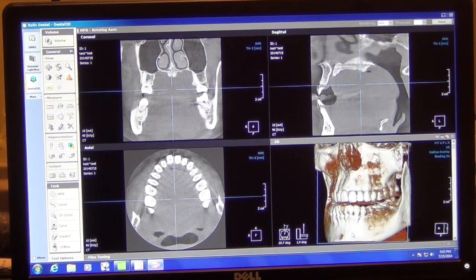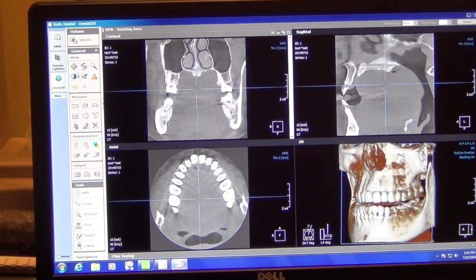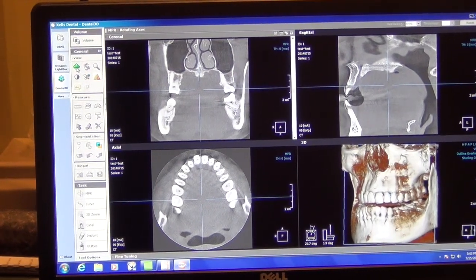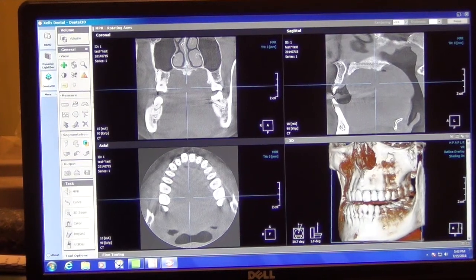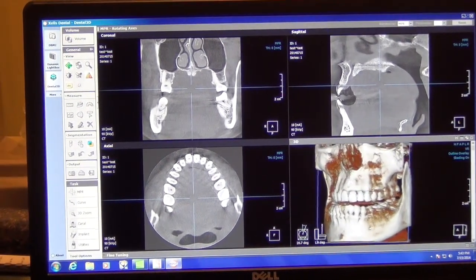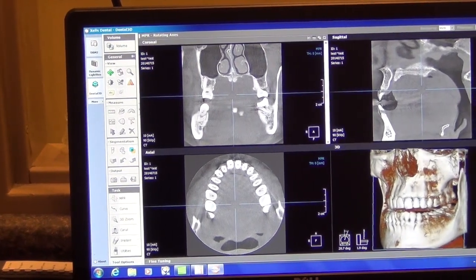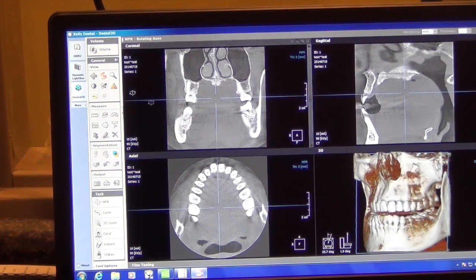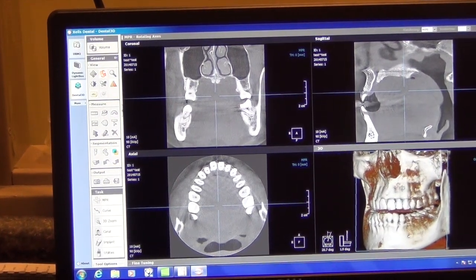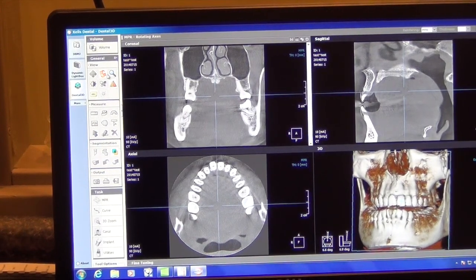Absolutely. So in the top left corner, we have them in different sections. The first section is basic view manipulation tools. So if I'm single left clicking on the icon here for pan, this allows me to move back over to the 3D reconstruction and just left click and drag and move the 3D representation wherever I want it to be. I can turn it off. Top left corner, I can also go to rotate. So doing a single left click on the 3D rendering will just rotate the image. I have the option to turn that back off.